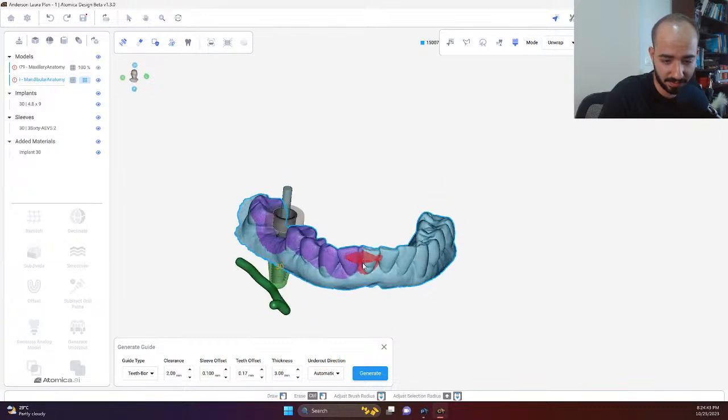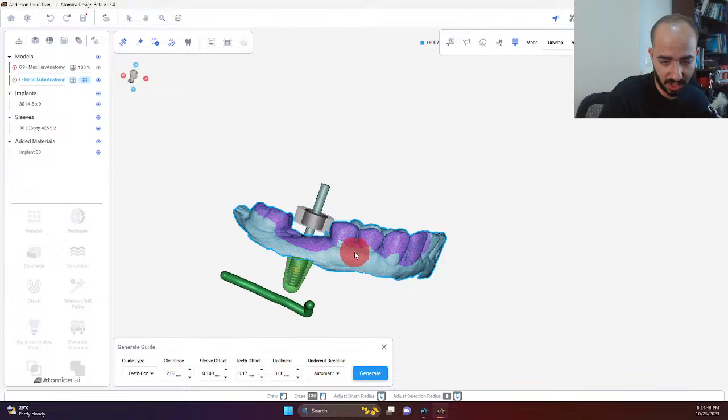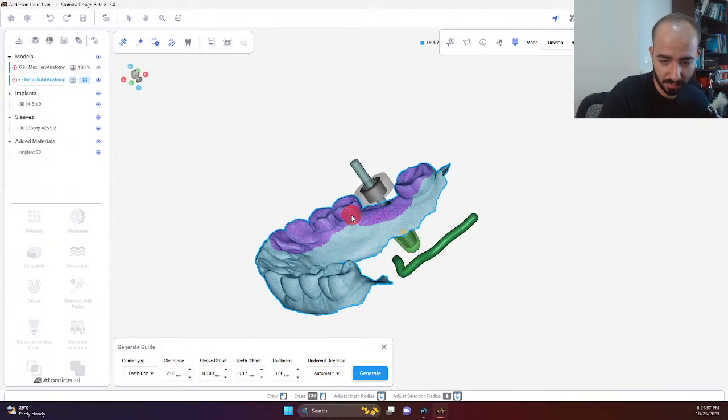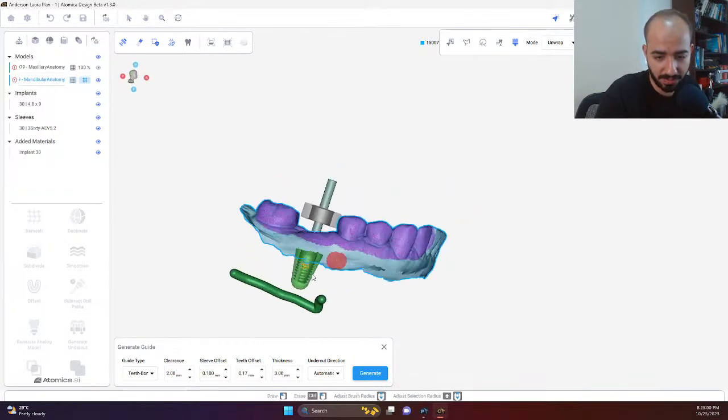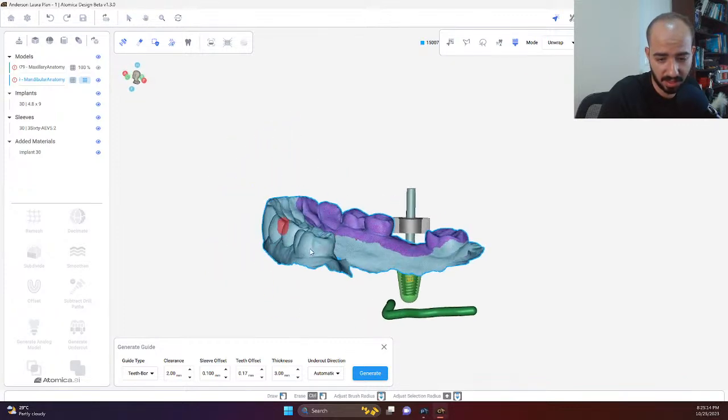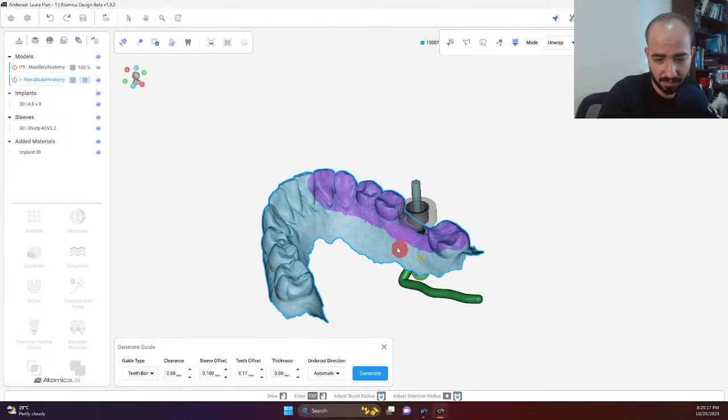Amazingly, right here, I can change the size of the brush using my scroller on the mouse. Okay, I'll start to refine that a little bit by tapping on Control and selecting. Tapping the left click on your mouse, you can start deleting or erasing highlighted areas. You can see that right here.